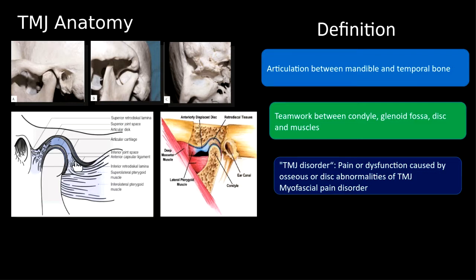The exam question will be: what is the muscle? What is the lateral muscle which is attached to the disc and the condyle? You can say condylar neck. The answer is the lateral pterygoid muscle. So that will be your exam question.